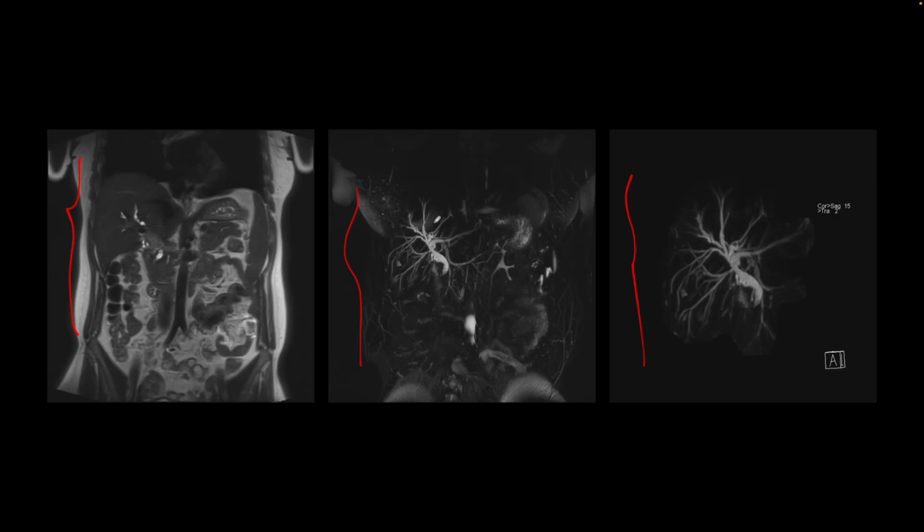So they have intrahepatic biliary ductal dilatation, they have extrahepatic or CBD dilatation, and as the CBD approaches the ampulla, there is tapering, and in this situation, we worry about a tumor. No tumor was seen on the MR, and no tumor was found on the ERCP, but a biliary stricture was found, and it was treated by dilatation during the endoscopy procedure.